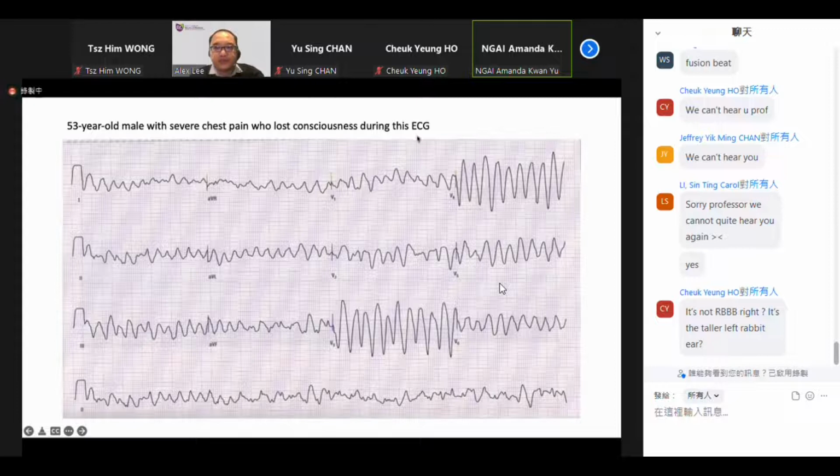Hello, are you here? Hello? Can you hear me? Would you like to take this ECG? Can you comment on this ECG? What do you see here? Can you hear me? Yes, I can hear you. Okay.